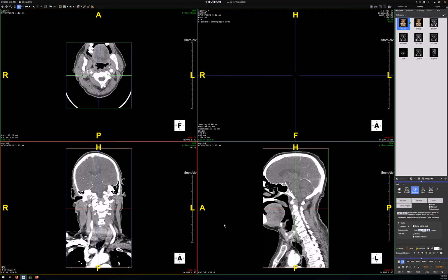Now, up in object space in the 3D window, you see you have your crosshairs. Yes. Just so you remember, and everyone else does in case we post this, X turns that on and off. Why don't you try that now? Just hit the X key. And then you can put it back on with the X key. Now, in the orthogonal plane windows, hover in the window below the one where you are. If you hit X now, that'll remove the crosshairs. Hit it again, and it puts them back. Nice, right? It works on all three of them.